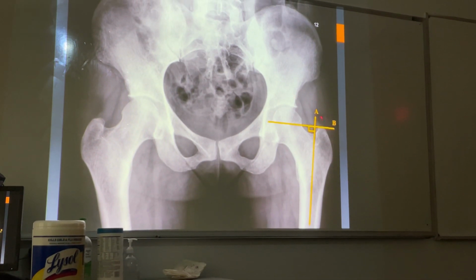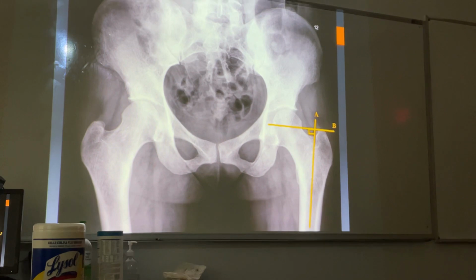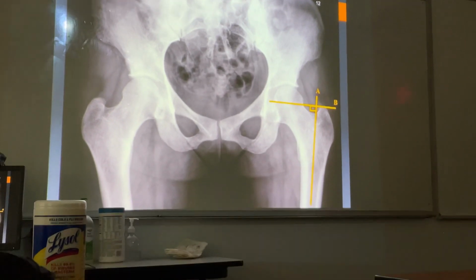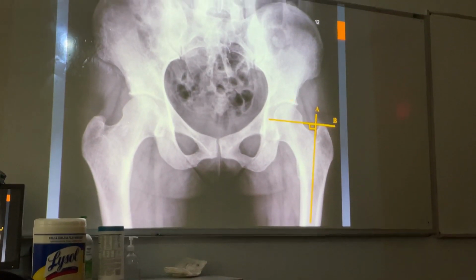When it's bowed laterally, same principle as the elbow. This is the little person that comes in limping. Their hip joint is filled with synovial or inflammatory fluid, and that's why they're limping. All right? And if you intersect with the x-ray at the right time, you will see capsular distension.